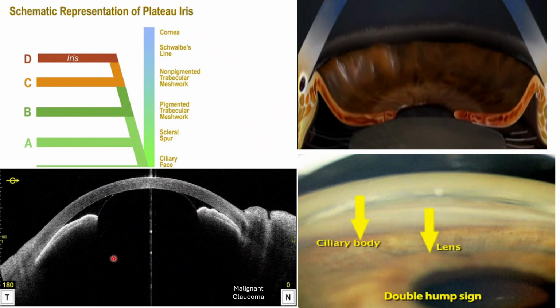This picture shows malignant glaucoma. You can see the shadow of the lens and nearly iridocorneal contact. The lens is totally touching the cornea, and the iris is also totally touching the cornea. This is due to pushing from this area due to maldirection or misdirection of the aqueous. So anterior segment OCT plays an important role in differentiating between different types of acute angle closure or acute elevation of the intraocular pressure, either plateau iris, malignant glaucoma, or acute angle closure glaucoma per se.